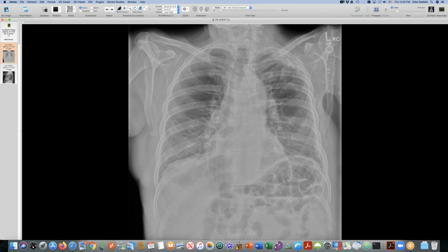That tells you that it's a through and through radiation rather than a conforming radiation field. And so this was osteonecrosis. It was familiar to me because of my familiarity with that old style of radiation for breast cancer, which they don't do anymore. But I think it was not even well known to some of our bone radiologists who have not seen this old-fashioned kind of radiation.